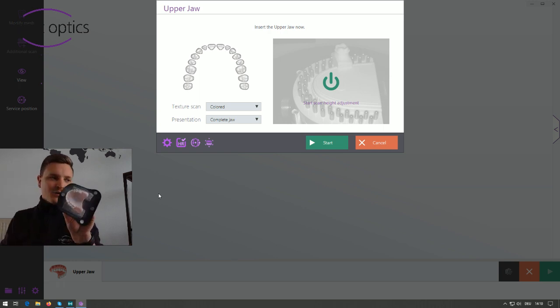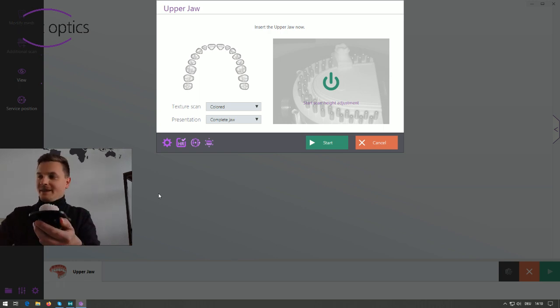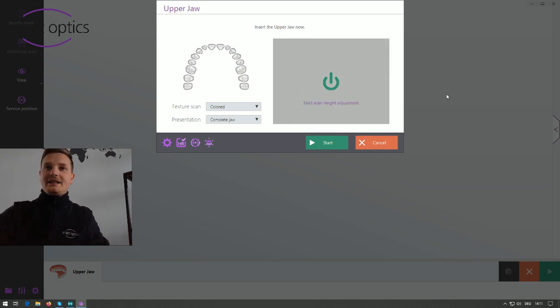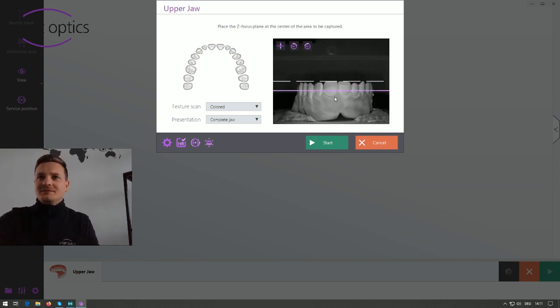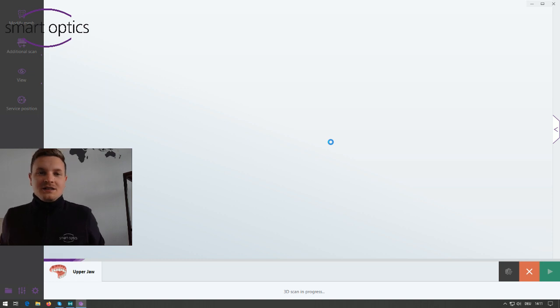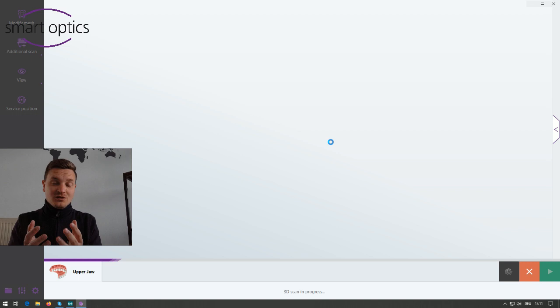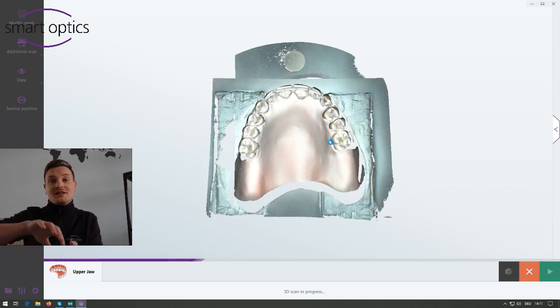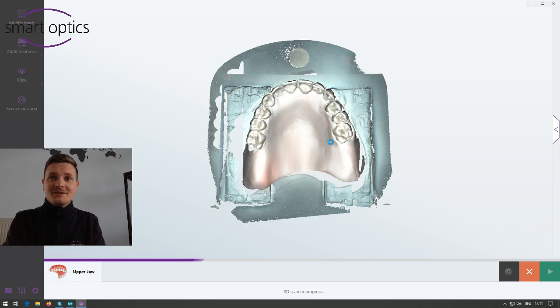Okay, then it's looking like this, sprayed. And then I can put it into the scanner and adapt the Z-axis side again. Need to get lower or higher with the Z-axis, of course, and start. So now important is that we scan the complete upper side of the total prosthesis, and then we will turn the prosthesis the other way around and scan the lower side or the underside.